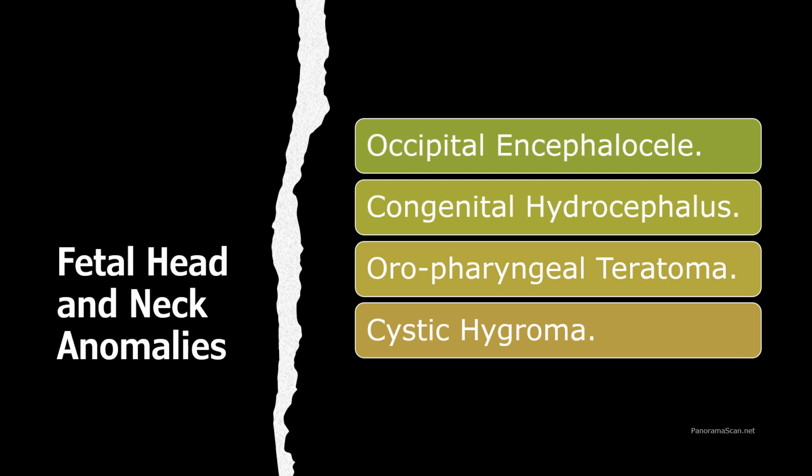Throughout this section, we will discuss how volumetric imaging enhances our ability to diagnose these anomalies with precision, assess their severity, and guide clinical management. Let's begin with our first condition in the fetal head and neck anomalies, occipital encephaloceles.